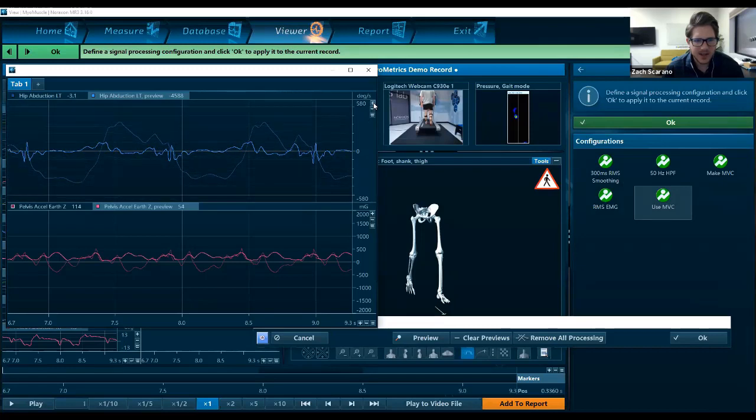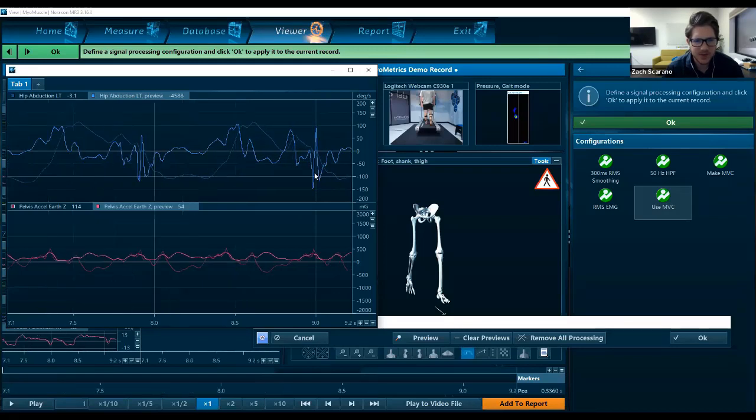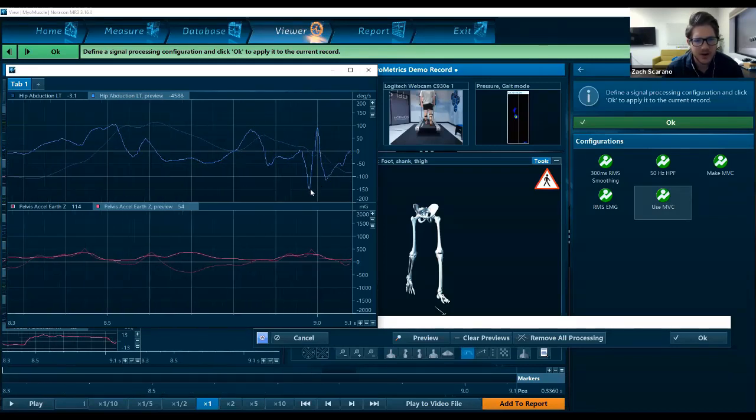This one typically zooms out like that, and so you do want to zoom in to get back to seeing a nice scale here. But you can see how even with the derivative, it's going to carry through some noise. So there's some jagged options here. And so this is something where maybe you'd want to filter this out even further, and perhaps look at the peak to peak and try to smooth it out a little bit. In this case, it's about 0.04 seconds, or 40 milliseconds.